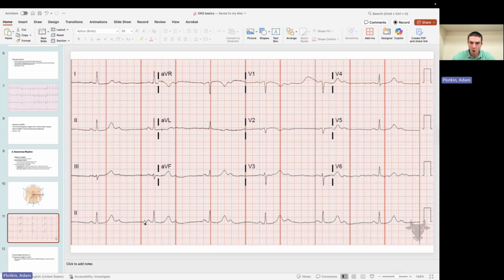And then we have a long pause. That's another thing that keys me in that this is a P wave that has a conduction block. If this were just a U wave without a conduction block, I should see my next P wave somewhere in here. We shouldn't have this long pause. Okay, and then we go again. Here's another P wave, the QRS, the T wave, another P wave not followed by a QRS. And then we start over again. Here's another P wave, the QRS.